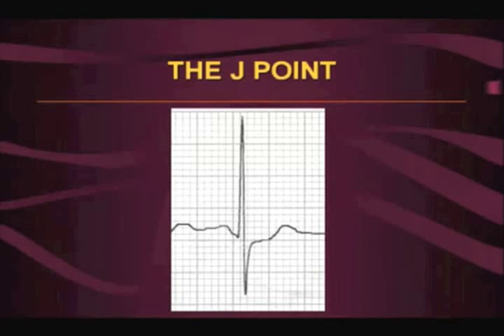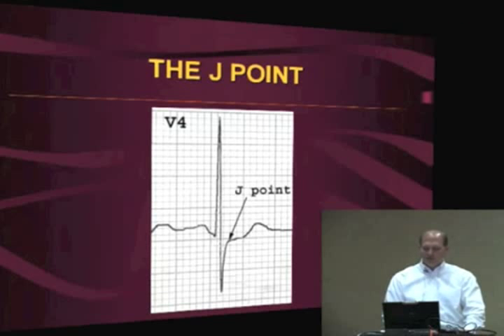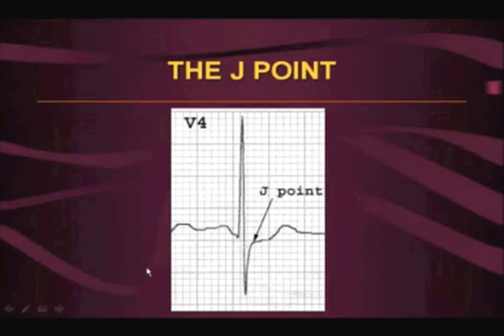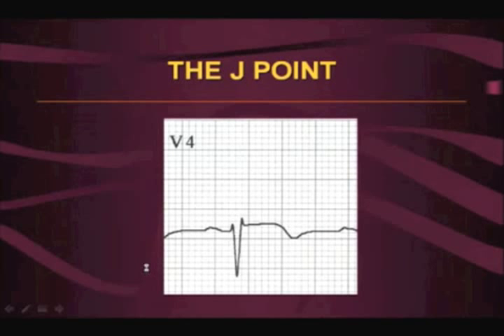So what do you think this patient has? So you measure it right there. That's where your slope starts to change. You compare it to here, and I'd call that a millimeter of ST depression. How about right there? What do you think that is? Yeah, I'd say that's ST elevation.